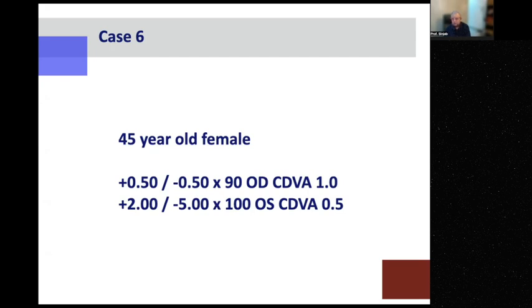How about astigmatism? What do you think about the astigmatism? Is it with the rule or against? It is against the rule astigmatism.